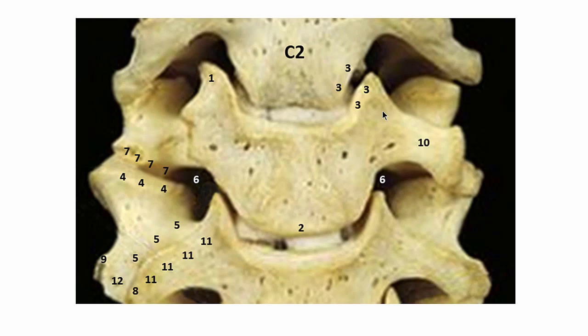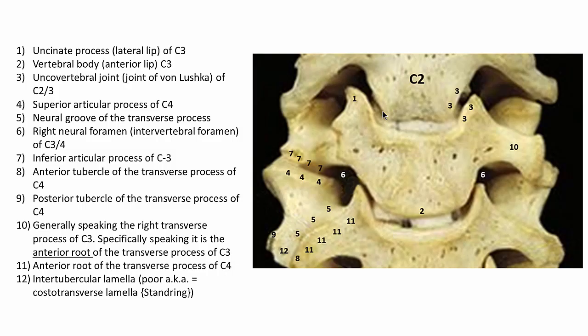Okay, I think we went through all this already. You can test your knowledge. I'll leave that up on the screen for a second. Alright, let's move on.